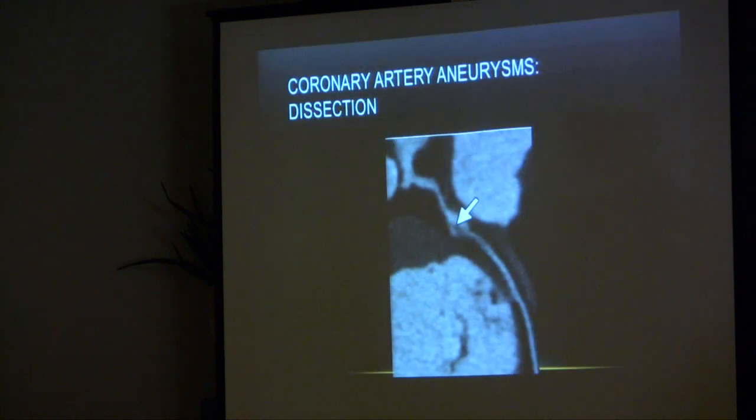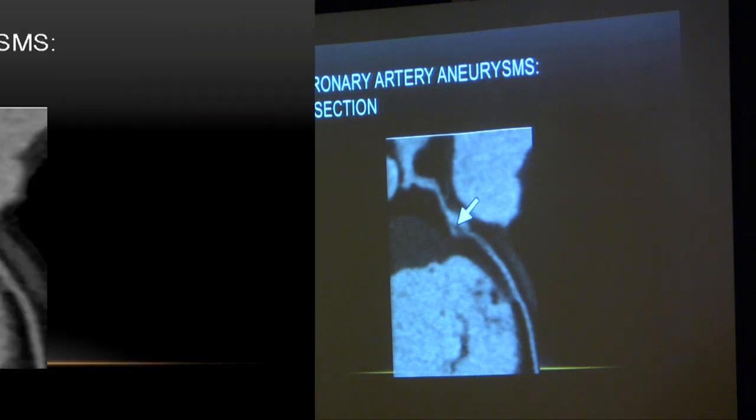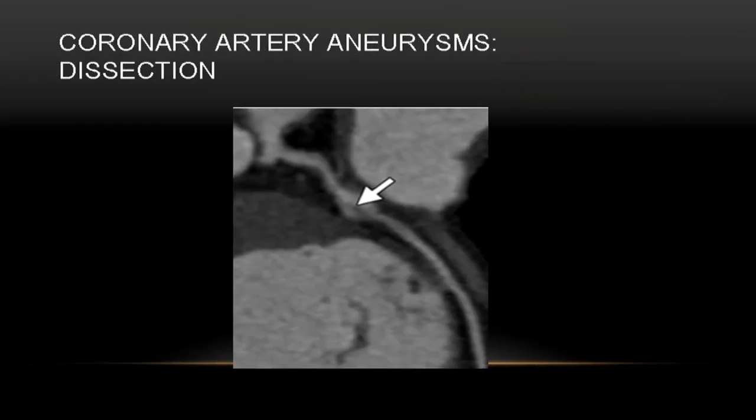And then we're able to see within the coronary arteries things that even on catheter angiogram can be a real pain to pick up, things like small dissection flaps here within an aneurysm that would be hemodynamically significant. So if that's the coronaries, and we've looked at inside the heart, what else does CT offer?